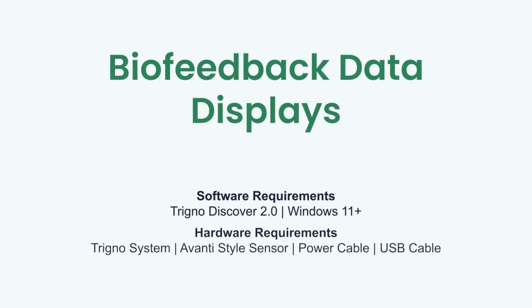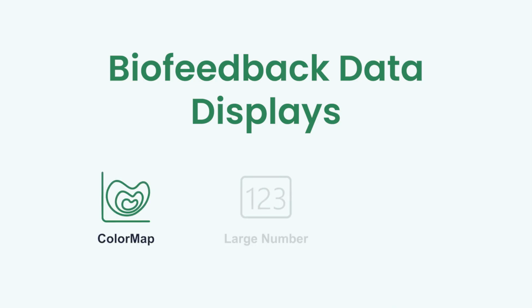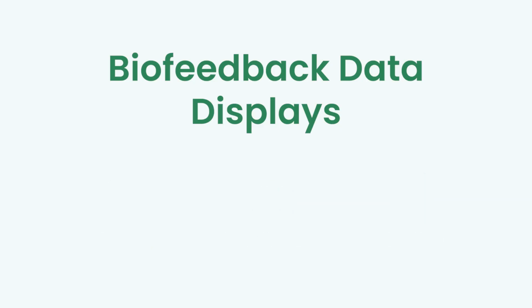This video will provide instructions on how to set up biofeedback data displays in Trigno Discover. Once sensors are paired in the Connected Sensors panel, biofeedback data displays such as colour maps, number displays and bar charts can be configured.